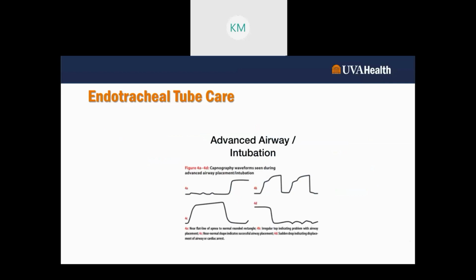So when we do have our endotracheal tube placed, there are a myriad of waveforms that we can see here. So we're looking at 4A, that's our upper left-hand corner. And I see a near flat line of apnea and moving into that rounded shape there. Now that's quite a long line of apnea, so what I'm thinking is potentially the physician just intubated the patient, and that big movement to that normal rounded rectangle there is when we deliver that first breath to see whether or not we're in the right place.